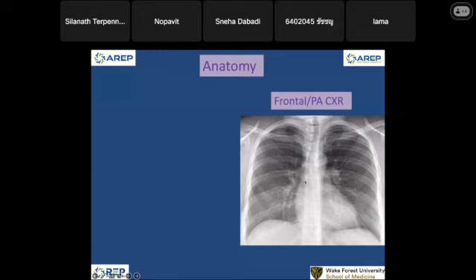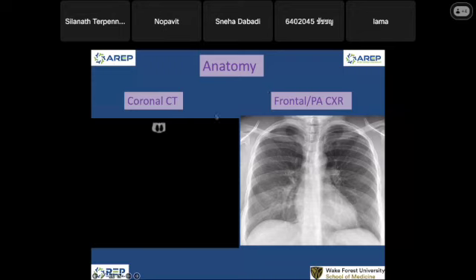We saw this yesterday. And look at our CT. When we scan the patient, we get axial images, and then we use software to reconstruct those axial images into sagittal and coronal. So I'm showing you coronal reformatted images of the chest CT.